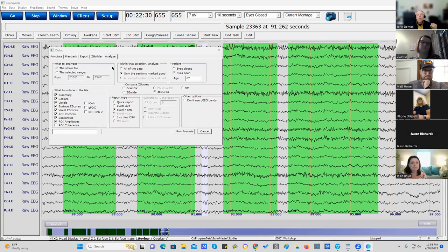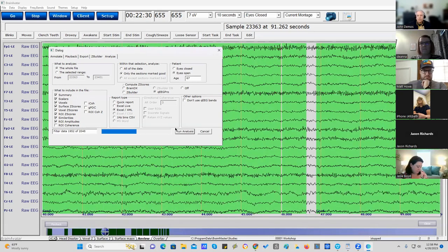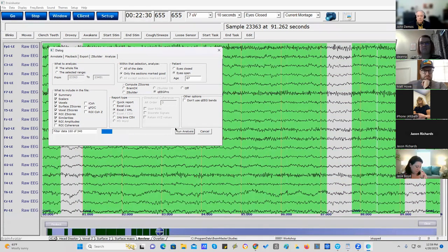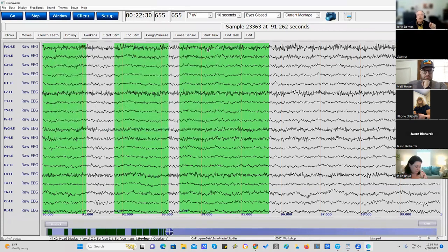Now, once in a blue moon, you have a perfect recording with a few epochs that are bad. And then I mark those sections as bad. But I almost never do that. It does happen though. All right, I'm going to run the analysis. Okay, the analysis is run.